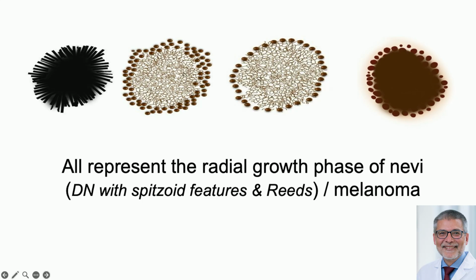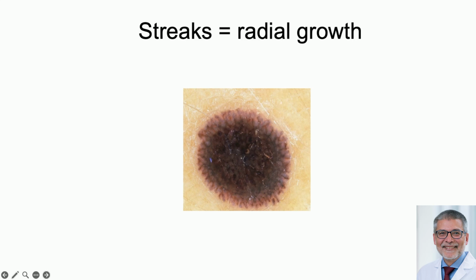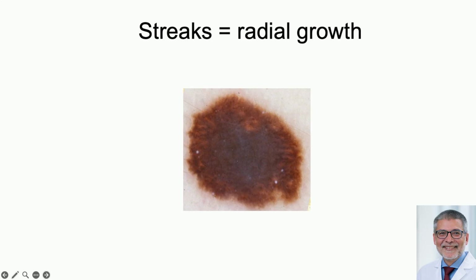Similar to the peripheral globular pattern, what this pattern indicates is that it's a Reed's nevus that you're catching in its evolution stage, right? Those streaks that create that starburst pattern are actually the expansion of the nevus, before it has entered senescence. If you were to follow a lesion that has a starburst pattern, you will see the same thing. There's symmetric growth of the lesion, and then eventually those streaks at the periphery will disappear, and when this Reed's nevus enters senescence, it'll have a homogeneous pattern with a central bluish hue. That is the senescent stage of the so-called Reed's nevus. These nevi can then undergo involution later in life, but at least for now, they have reached a state of senescence. So it's a benign lesion.